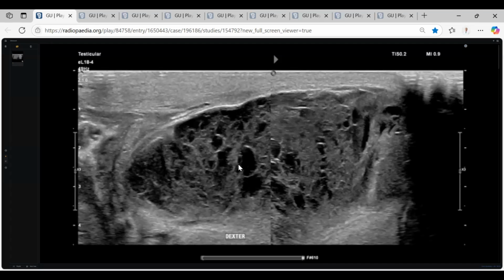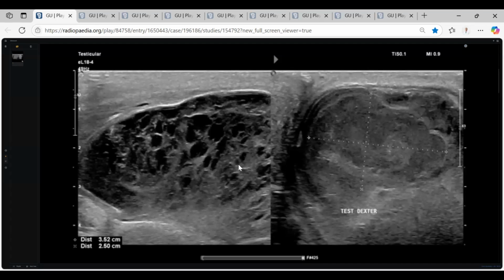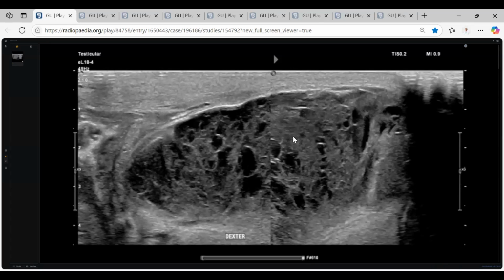Again, what happened here? There was a testicular rupture, and then something was released from the testis into the scrotum, and it was neglected. Infection occurred and pus formed. This is a pyocele. Thank you, doctor, so much. This is a testicular rupture plus pyocele.